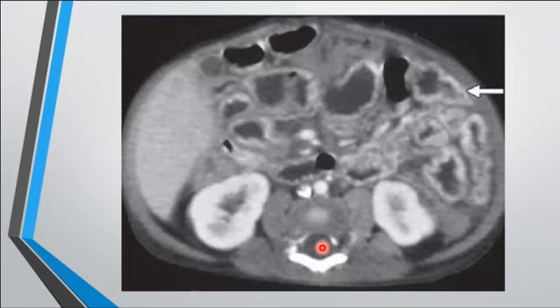Can anyone give at least a description of what's going on here? No history of trauma. There is bowel wall thickening. What kind of bowel wall thickening? Describe it in detail. So there is diffuse small bowel wall thickening, with mucosal hyperenhancement all over the small bowel.